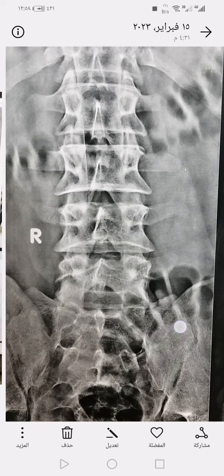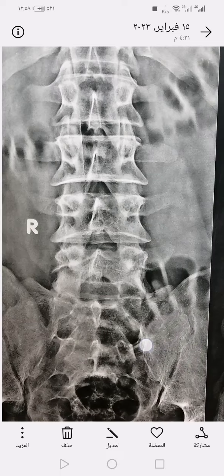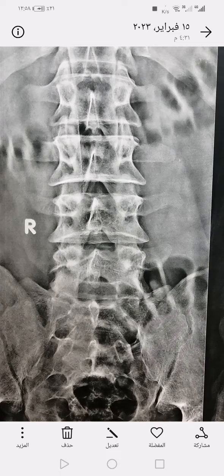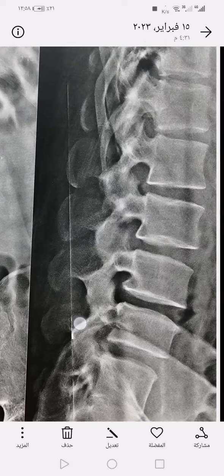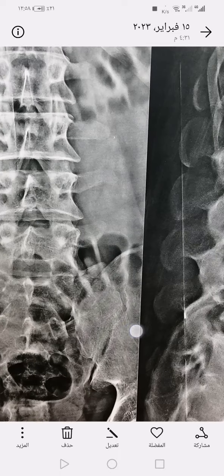The opposite is lumbarized S1, which means that the lumbar vertebrae may be 6. One of the sacral vertebrae, S1, is separated from the sacrum and became similar to the lumbar vertebra. So we have here sacralized L5 and lumbar muscle spasm, both of which can cause back pain.